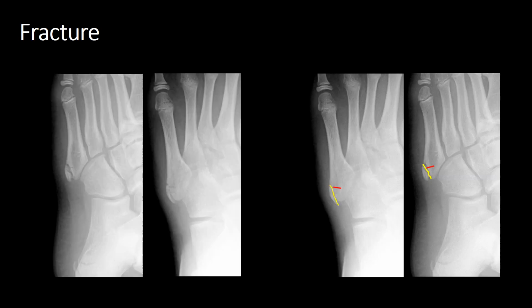Okay, so let's have a look at this image. We've got here an apophysis and a fracture. So our apophysis lies parallel to our metatarsal, and here we can quite clearly see a lucent line running horizontally, indicating that this is a fracture.